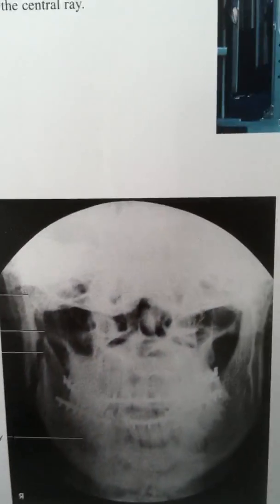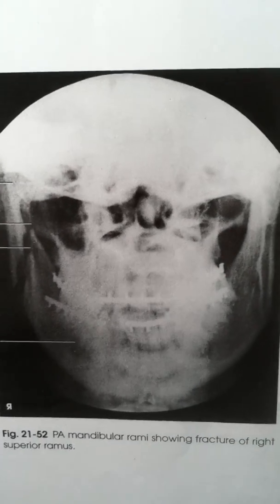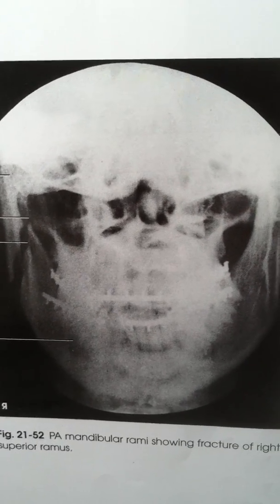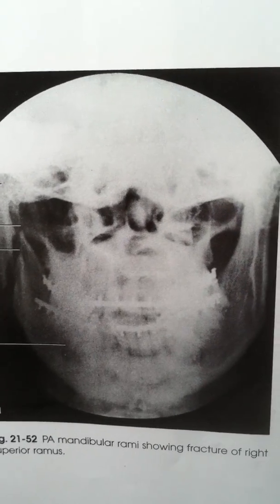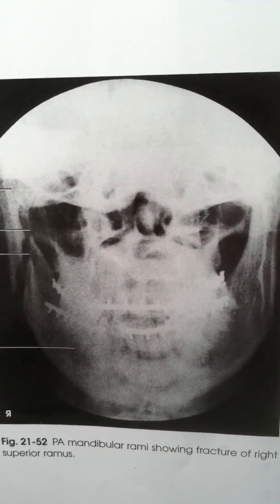So the next shot I did was the PA mandibular rami, and this demonstrates mainly the mandibular rami on both sides. It includes the entire mandible.